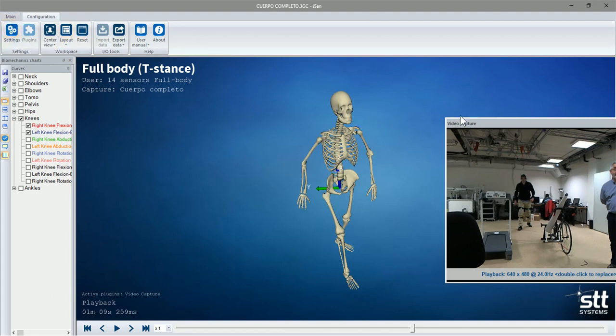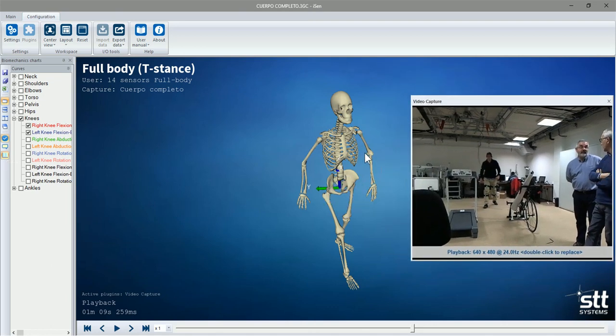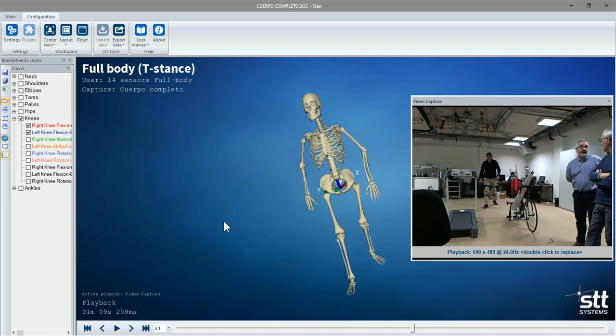Well, I guess that's it. So I hope I gave you a general overview. Obviously, there was something missing here, which is the actual recording of information, which can be done through an online presentation, which I will be glad to show if needed.